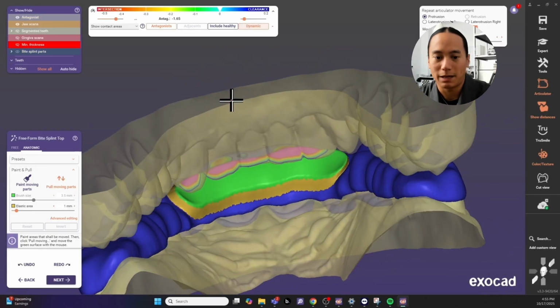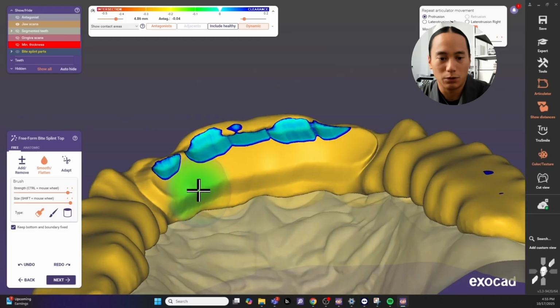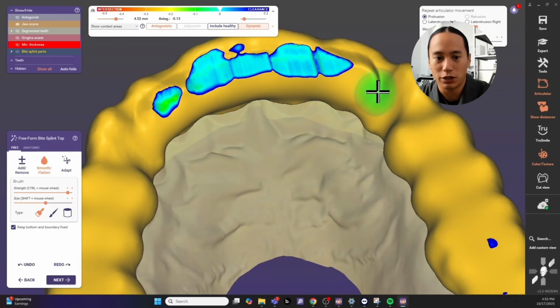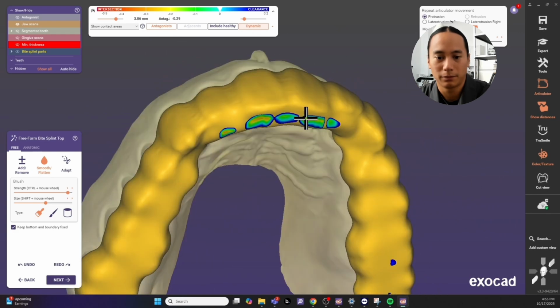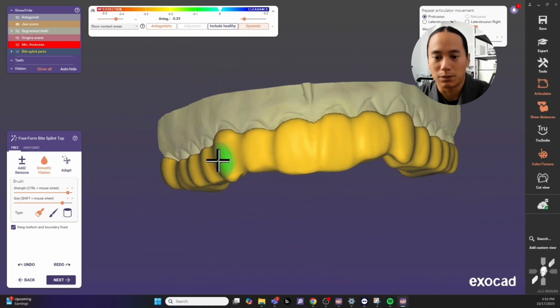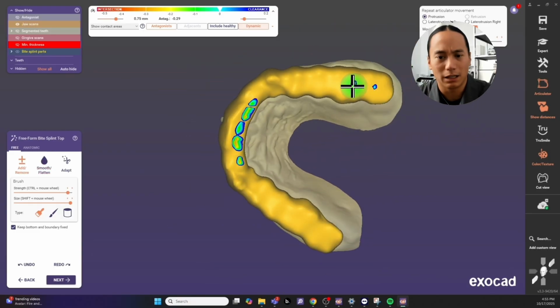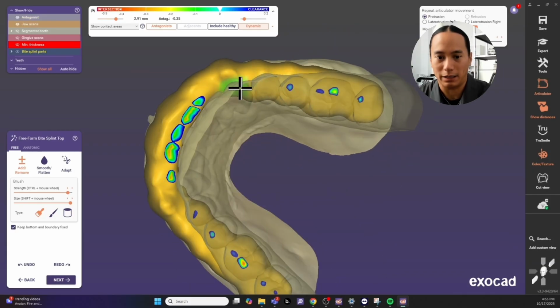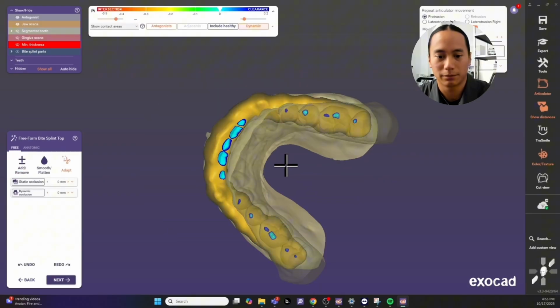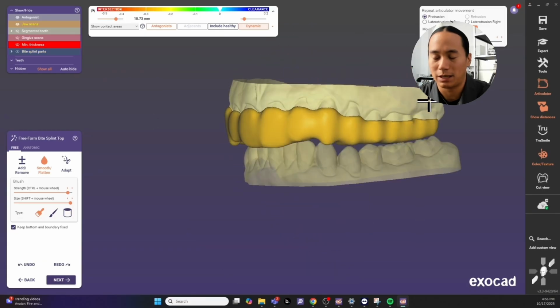And if I turn on dynamic, I can see how heavy I am again across my protrusive movement. And then I'm just going to do an automatic adaptation and then smooth out that area to create my anterior ramp of my night guard. Again, just smoothing out the facial and buccal surfaces. Again, just adding a little bit back so that I'm contacting upon rest there in that open bite position. And then I'm going to go back in and kind of smooth and readapt from here. And if I'm a little heavy in that specific contact point, that's okay.